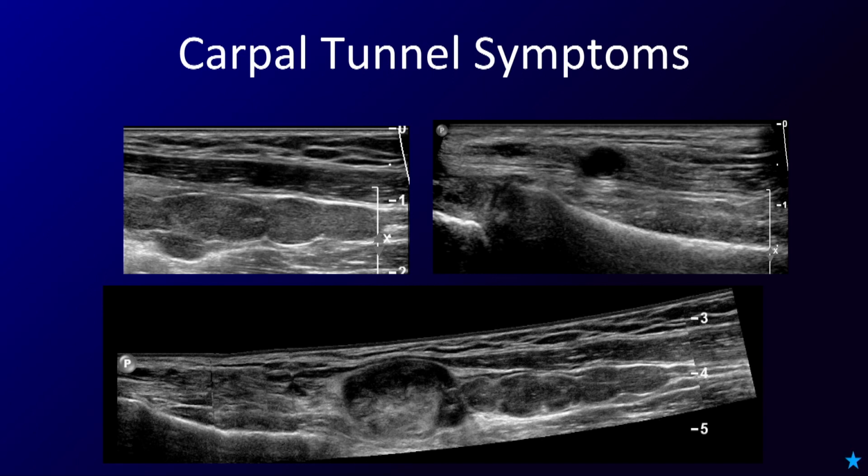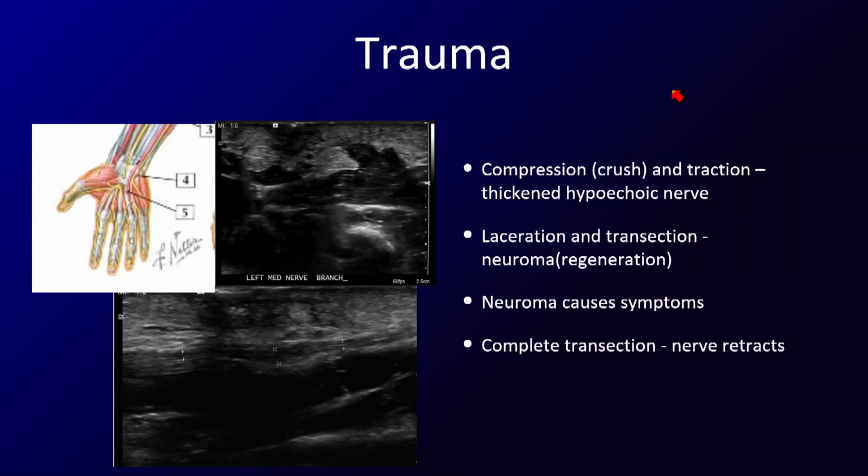So the patient went to the OR. Typically, these are done with the patient awake, but with a block. And so after this was peeled off the nerve, the patient said, I still feel symptoms in my thumb. I wheeled the machine down to the OR and found another neuroma involving a branch of the median nerve extending into the thumb, which she just opted to leave behind because now we found the reason. Very nice show of what ultrasound can do for you.